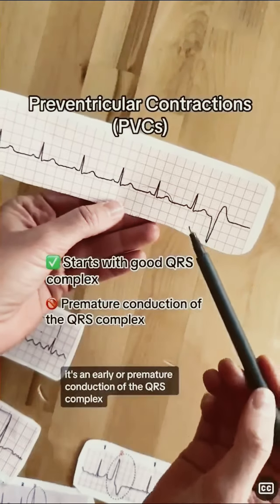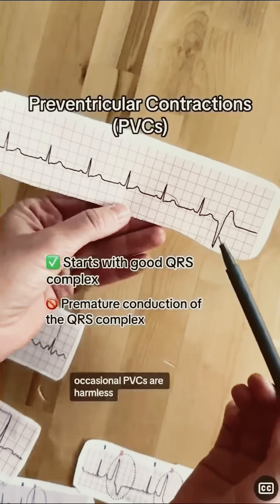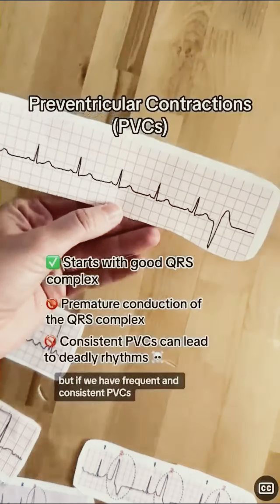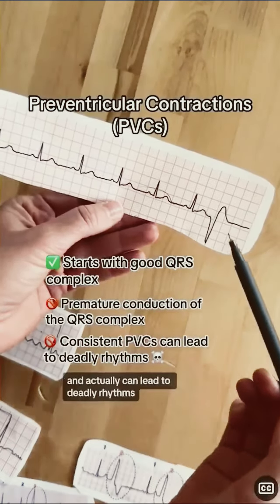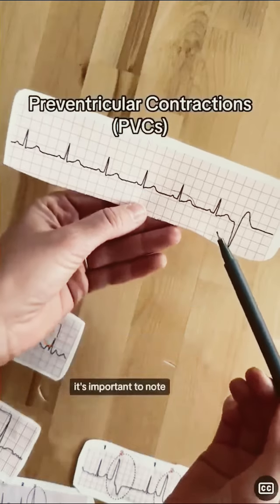It's an early or premature conduction of the QRS complex. Occasional PVCs are harmless, but if we have frequent and consistent PVCs, that's when it becomes an issue and actually can lead to deadly rhythms.